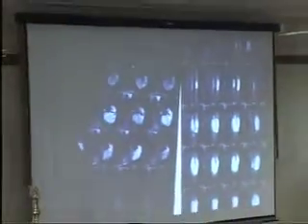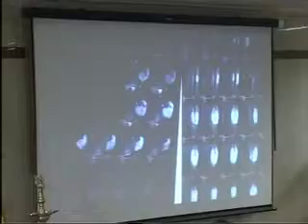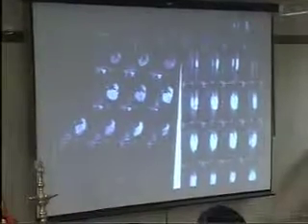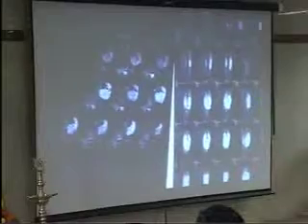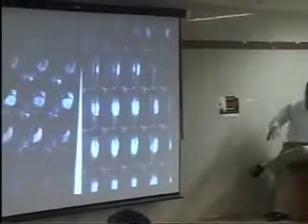It is difficult to say considering the previous surgery has taken place, but it looks like it is going from posterior, mainly posterolateral, posterior but going into the lateral compartment. So basically, when we do MRI, there are different sequences we take. That's a T1 weighted, T2 weighted. We also take STIR or the inversion recovery, what Dr.